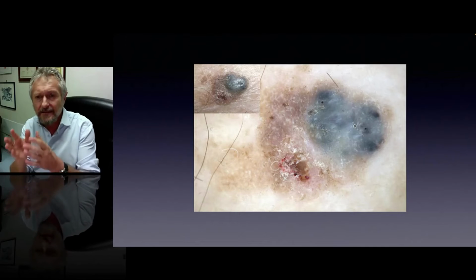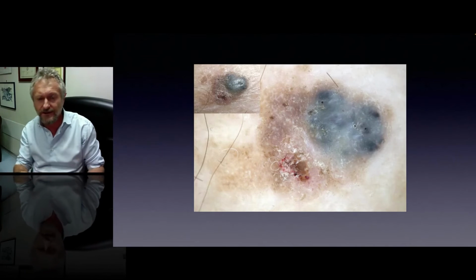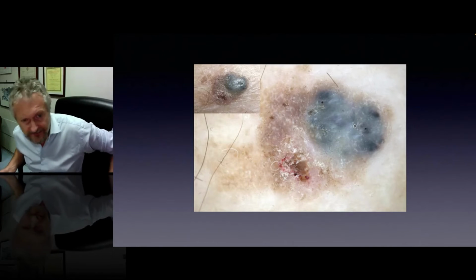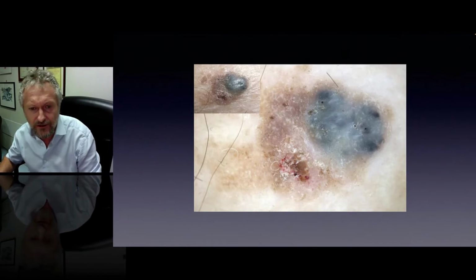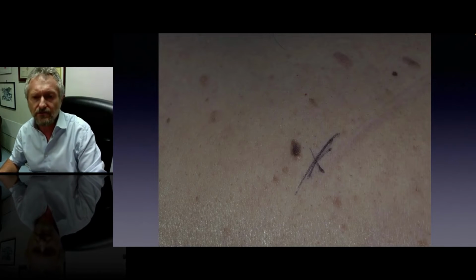This is again a quite difficult combination of a basal cell carcinoma and a seborrheic keratosis. In this case, the basal cell carcinoma is showing a more compact blue-white coloration, while the seborrheic keratosis on the left is more clearly visible with multiple milia-like cysts and a little bit of irritation at the bottom side of the lesion. Collision number two is this one. This is also very frequent.